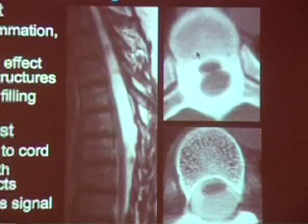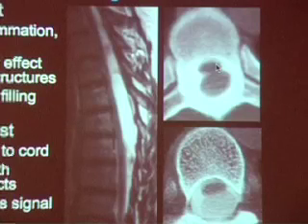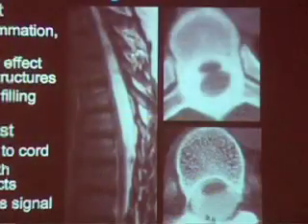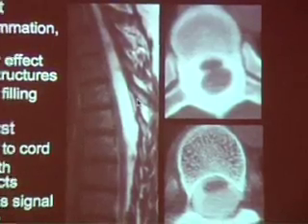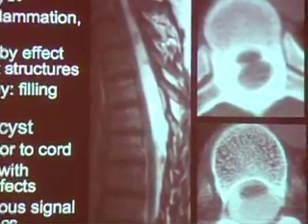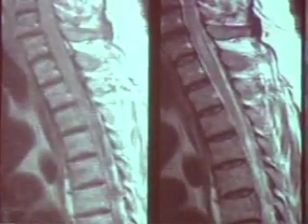When we look at the myelogram, it looks like this patient has two spinal cords, but in fact, this more anterior structure is the compressed and atrophic spinal cord. This more posterior structure actually filled in with Omnipaque at the time of follow-up. And this patient had a large dorsal thoracic arachnoid cyst and subsequently underwent a laminectomy and decompression of her arachnoid cyst. She had no history of prior infection or trauma, and it was unclear if this was congenital, or what the problem was with regard to that lesion.